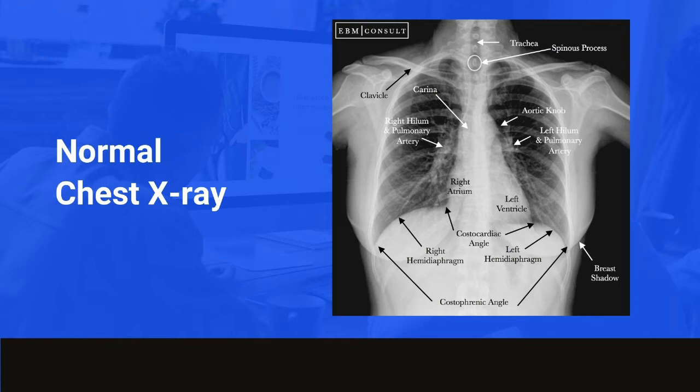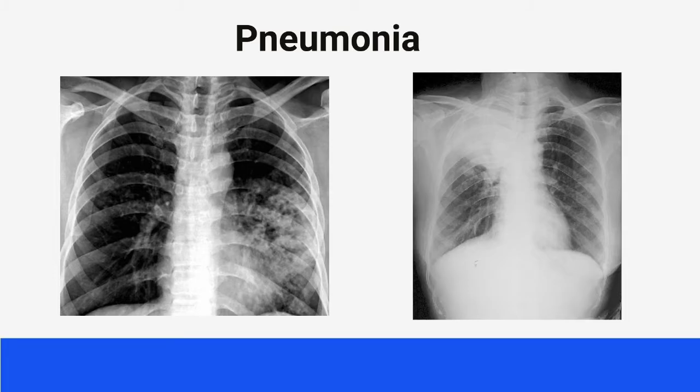There is another view, that is the lateral view of the chest, in which we can see the lung fields, the heart shadow, the thoracic cavity, and the special features which are not clearly visible in the posterior anterior view: the retrocardiac and the retrosternal air spaces.